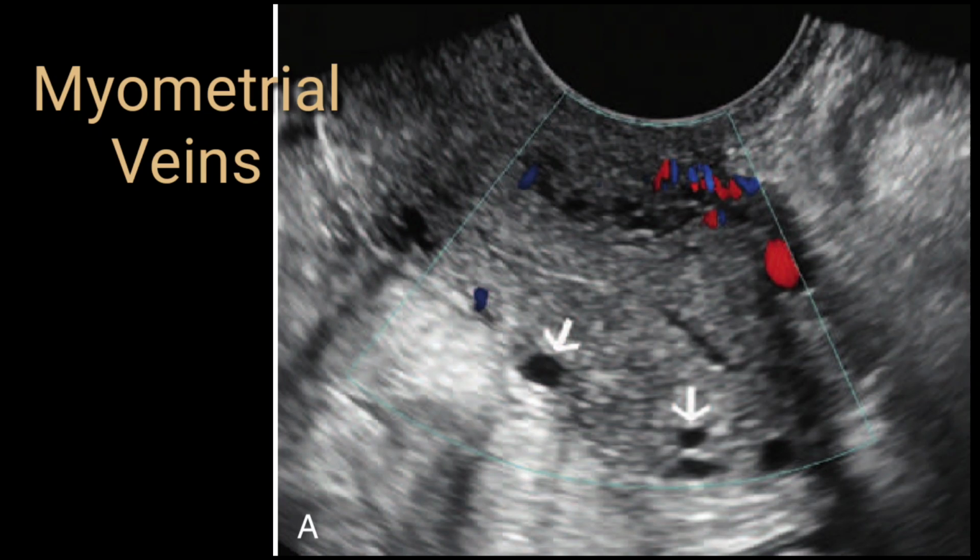Although this myometrial pattern looks slightly heterogeneous, you should not be confused, because this is the normal pattern of the peripheral vascularity in the peripheral myometrium. It should not be confused with pelvic congestion syndrome, which I will discuss in later videos. Here this is a normal pattern. If you can see the vasculature or peripheral vessels within the myometrium up to that limit, that would be absolutely fine. So this slide shows myometrium with normal peripheral myometrial venous structure.